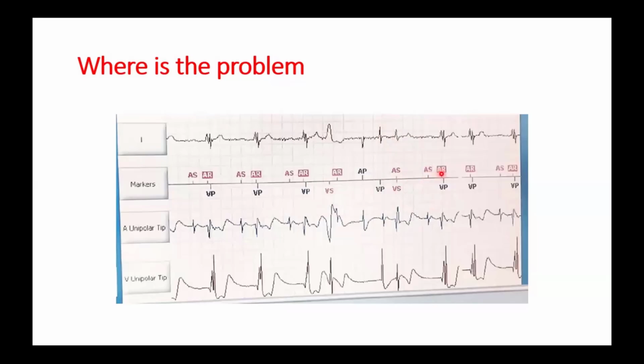There is oversensing, far field, and the sensing of the R wave. Also, there is failure of atrial capture.